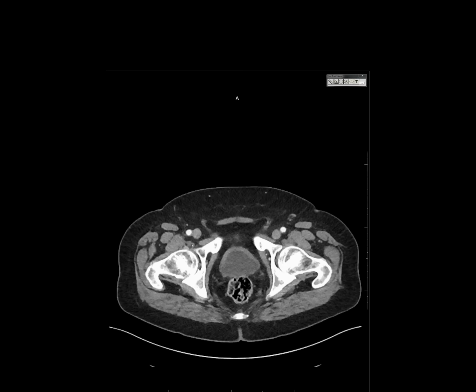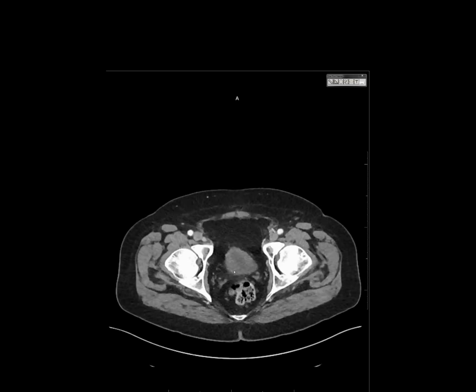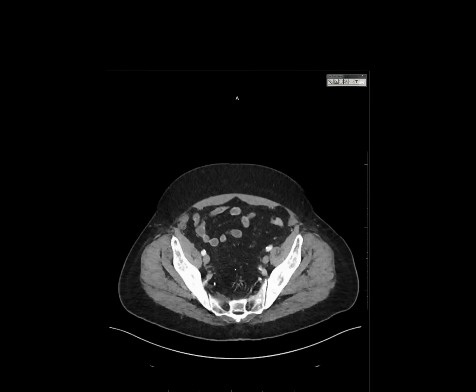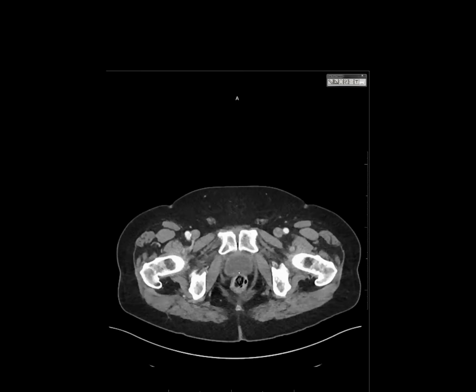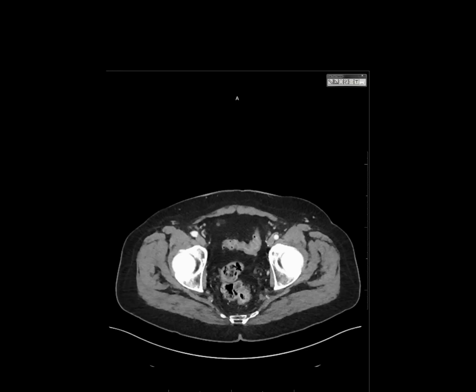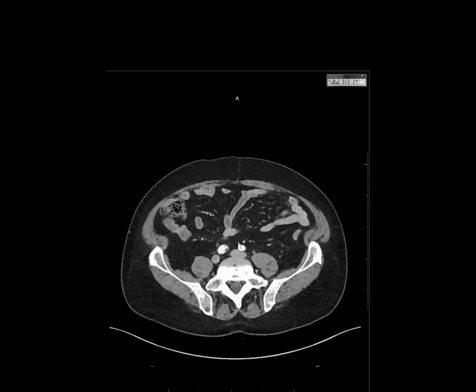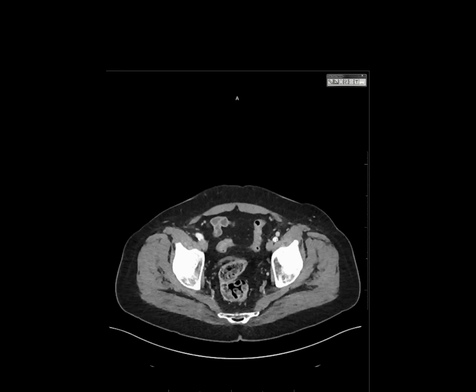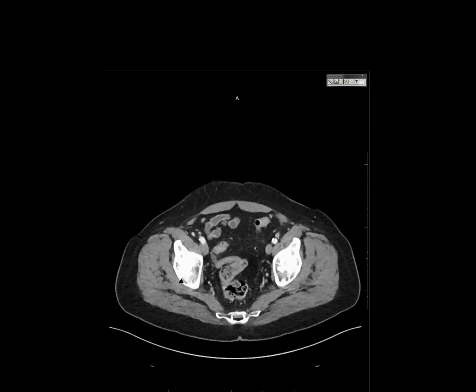Okay, let's review our second prostate case. I just want to reiterate the bone findings on this case. This patient has been treated in the past. They've had a prostatectomy, as you can't really see it there. The bladder's still there, which is one form of therapy. So again, if we're going to talk about lymph nodes and evaluation, I want to follow the external iliac chain. That's where it's going to be most common.